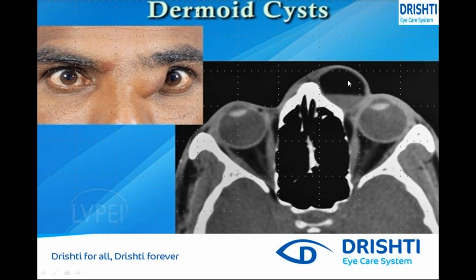While seeing this, it is not malignant, it is not a tumor that spreads, it is benign. There are two types of tumor, benign and malignant. This is a non-spreading type of tumor. In these cases, it can be removed cosmetically. While removing, the surgeon needs this scan so that the extension of the tumor can be seen and it can be removed easily. So these are different cases seen while doing a CT scan of the orbit.